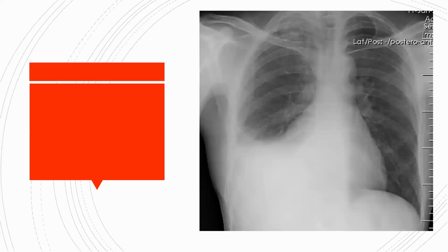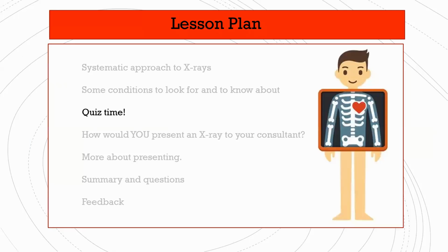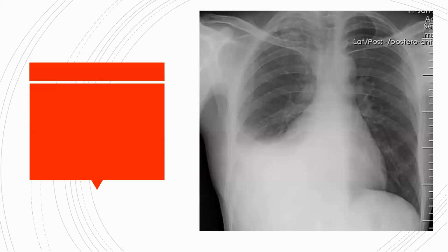Right, quiz time. So I really need you guys to be interactive for this one. Either private message me, then no one can see it, and that's fine, or you can just post it in the chat. What do you think this X-ray shows? I'm going to give you 30 seconds.